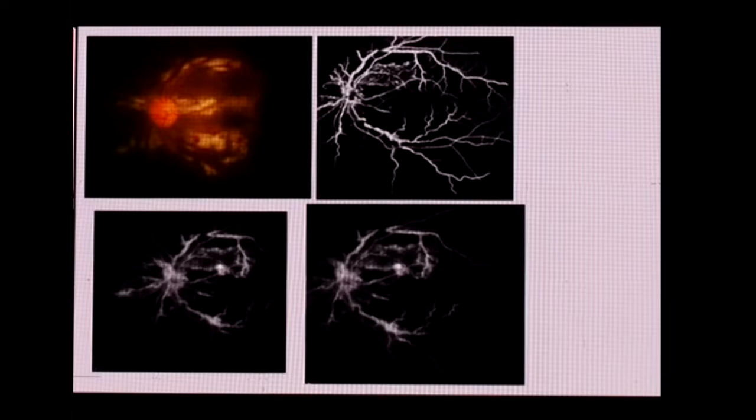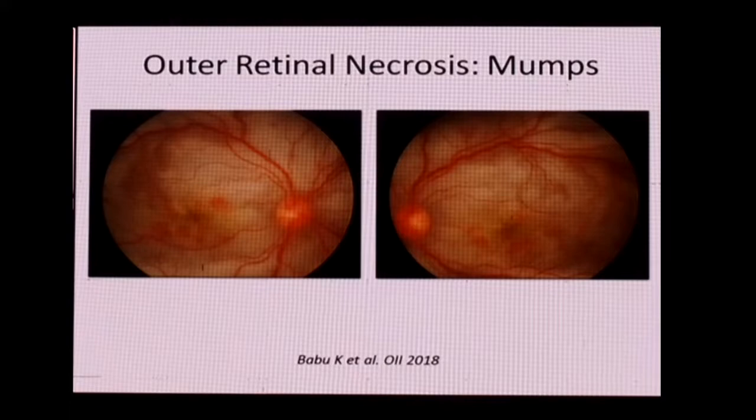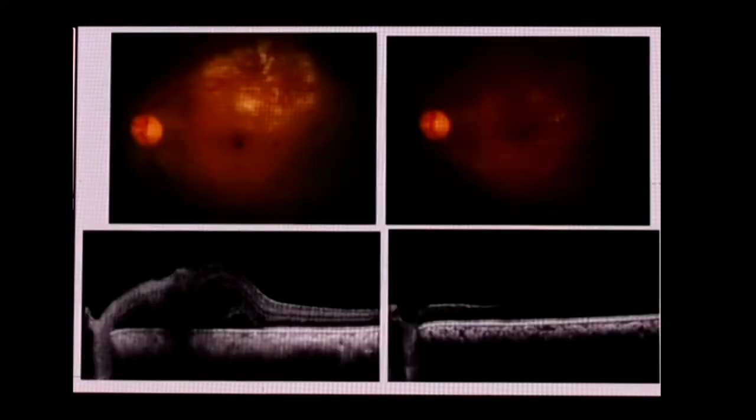Unfortunately, we could not do OCTA in these patients because of the serous elevation which was there. And this is again the OCT, which shows these round deposits on the retina, thick posterior hyaloid. Again, you are not seeing the choroid very much, and there's a lot of fluid. So to assess the visual prognosis, it has helped in the sense these patients have done well. When you look, they look terrible, but over a period of time, the layers are quite okay.